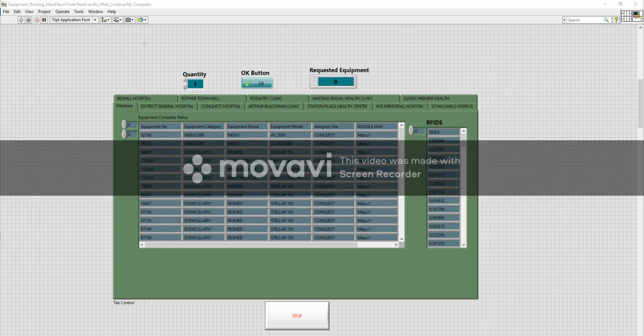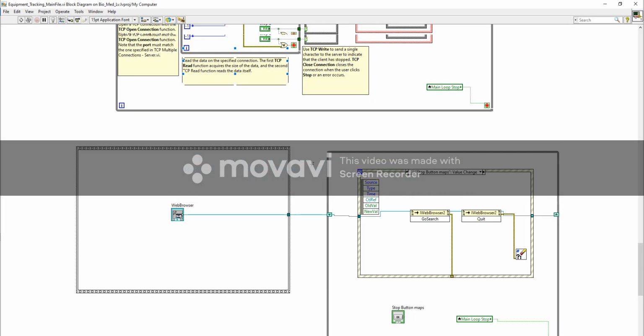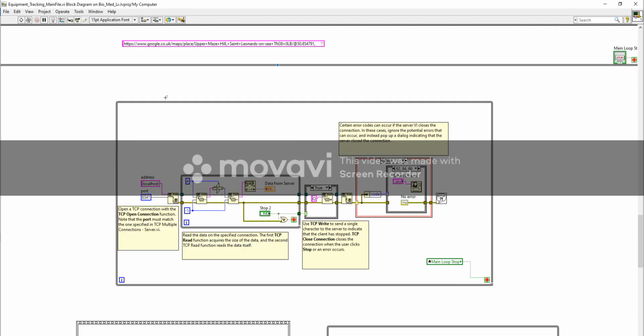Hello, how are you? I'm going to start the simulation version of your project, in which I will elaborate about the complete simulations related to each module and the integration, and finally the GUI that you can see.